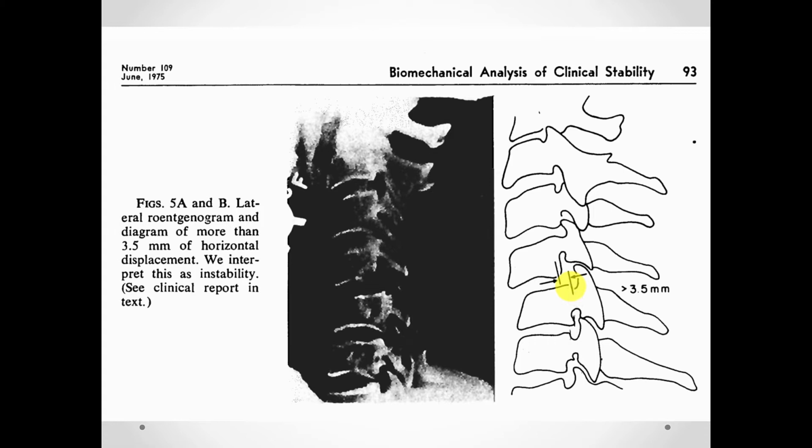And especially in the way the guides are interpreted, this may not be picked up. Now, obviously in the posterior tangent method of instability analysis, we are rating this. So what's nice about PostureRay is you have multiple methods of instability analysis, and based on your clinical opinion, you can apply what you need to, okay?